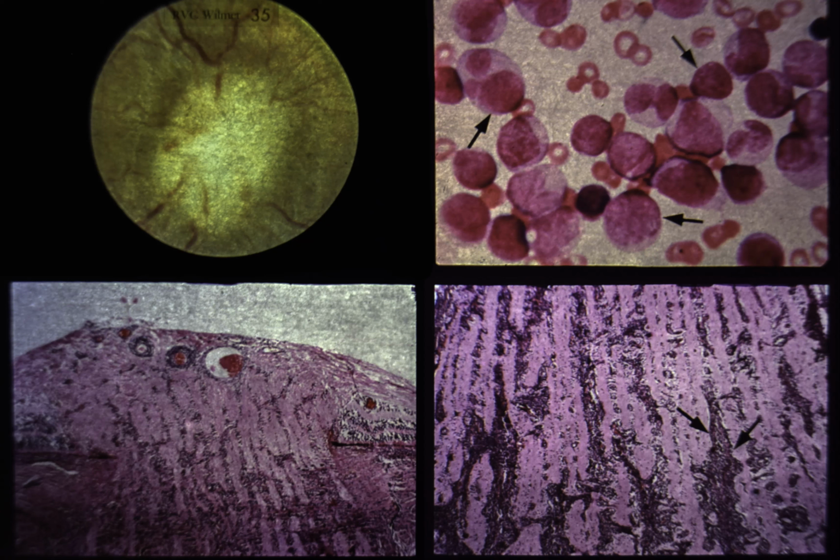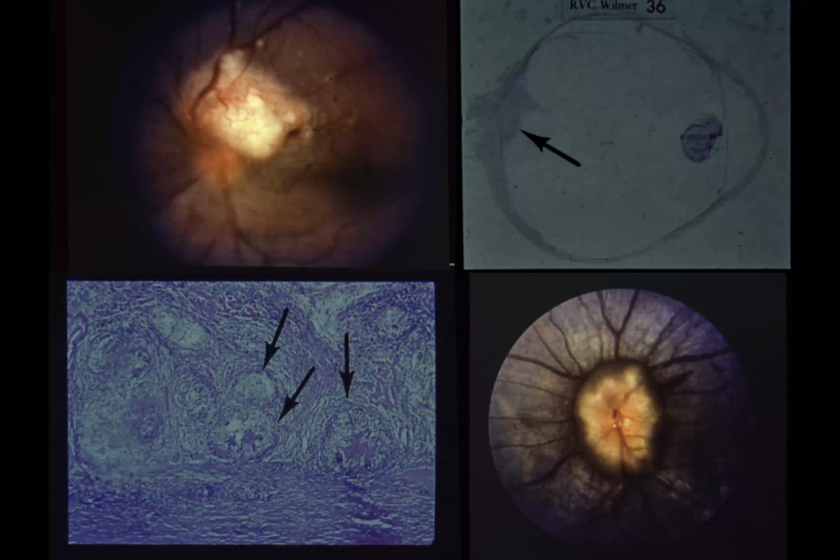The optic nerve may be infiltrated by reticulum cell sarcoma, lymphoma, Hodgkin's sarcoma, and metastatic carcinoma, in addition to leukemia. Although infiltration of the nerve head does not necessarily indicate increased intracranial pressure, the ophthalmoscopic picture is often mistaken for true optic disc edema.